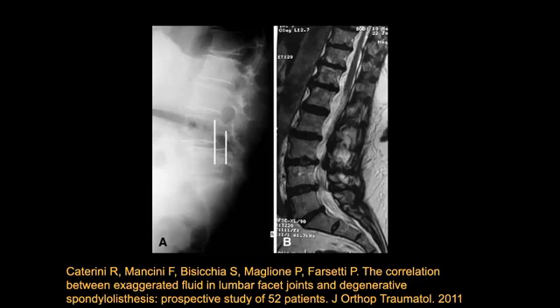more informative than flexion extension views, where you basically have the listhesis there, and then they do flexion extension maneuvers, but maybe the excursion is not so great, or they've already loaded the joint and they've already put them in that pain position. Whereas doing recumbent versus upright imaging can be very informative. So when I see this, I'll mention that finding and suggest that at that motion segment, there is a component of instability or hypermobility.